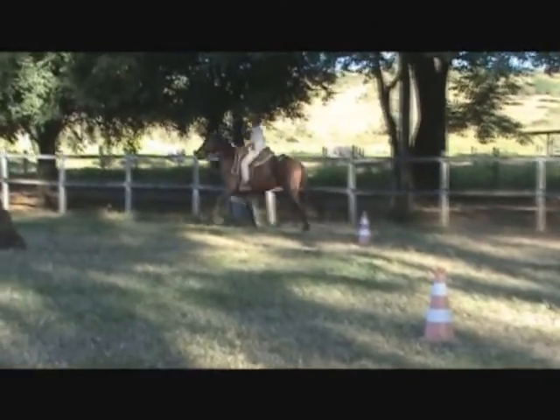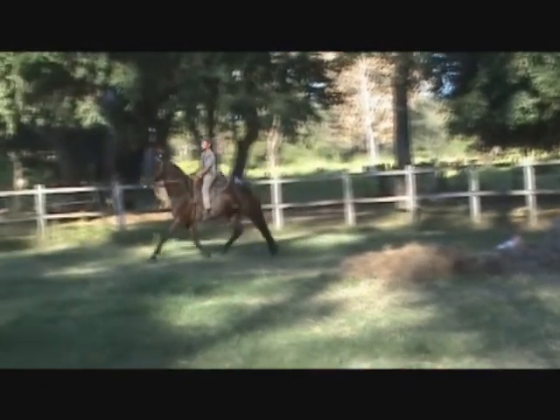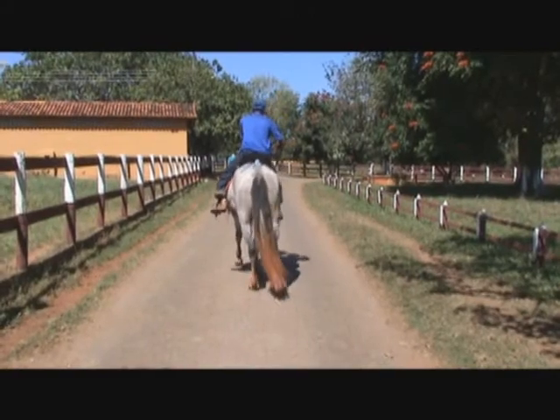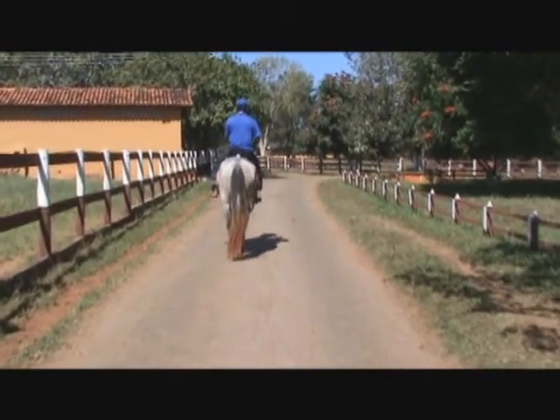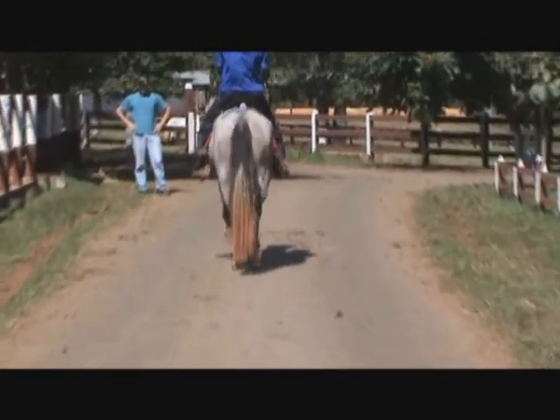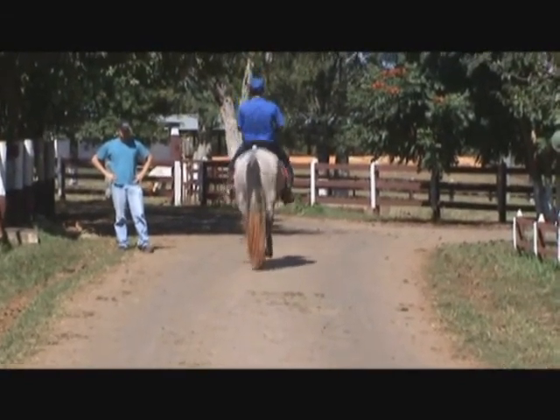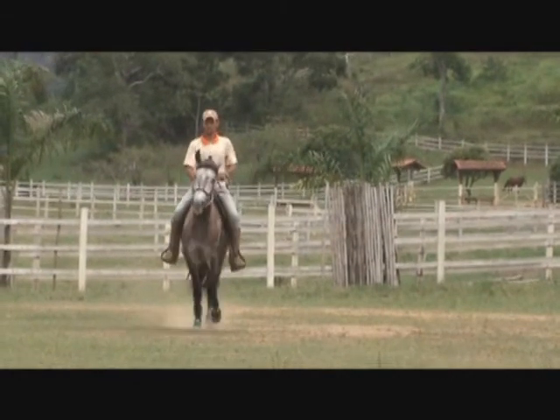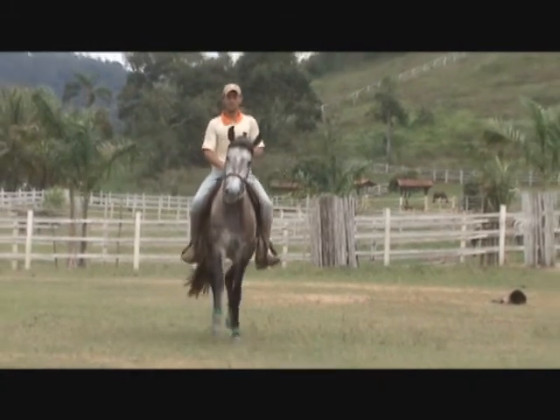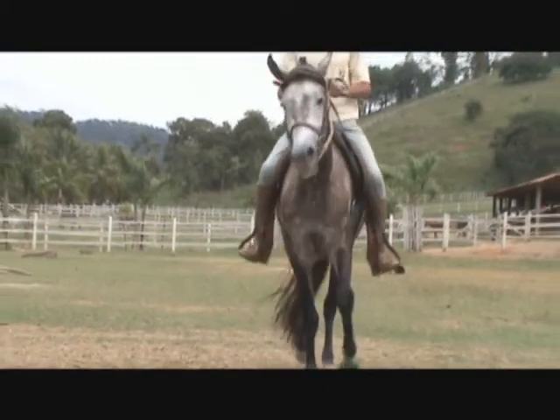Although relatively uncommon, Lameness Locator software more often does not select all trotting strides wanted than it does select unwanted non-trotting strides. The most common reason for not selecting all desired trotting strides is when a horse trots noticeably faster or slower in one segment of a trial than in other segments. In the uncommon situation when not all strides desired by the user to be analyzed are selected, the user can adjust the delta value to select more strides. This option is presented to the user very shortly after beginning an analysis.